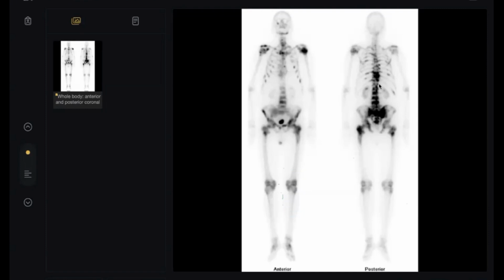Sir, I guess the metastatic. No, not the normal. See, this is very important. By the way, thank you. Your answer is good and brilliant. But what happened, my colleague, when a metastasis goes to the bone? The osteoblast in the bone itself, which is a normal bone cell, starts to be activated. Why?